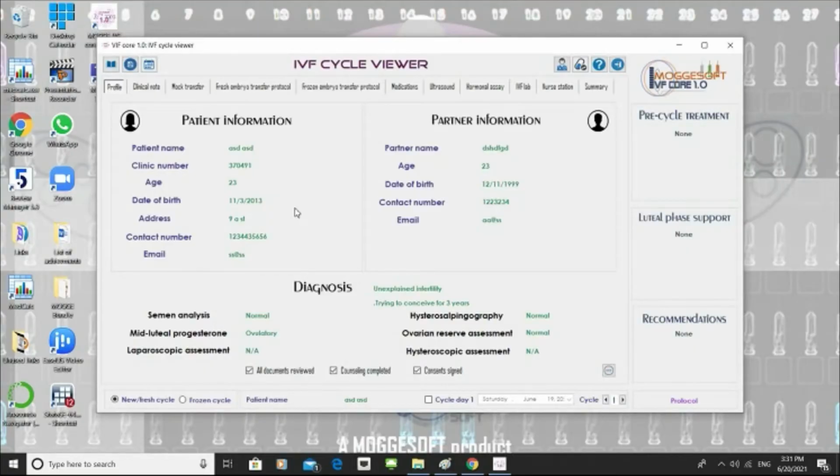Welcome back. In this video, we're going to chat about a very important thing, which is how you can choose a protocol for your patient. Here I mean that you don't have to describe the protocol in detail, but actually pick one of the built-in protocols that are already present in the software.